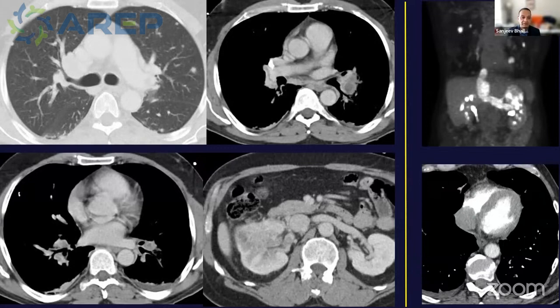Do you see bronchial artery enlargement, which is going to be much more typical of something like chronic PE or Eisenmenger syndrome than it is for acute PE? And of course, looking at the lung parenchyma, do we have mosaic attenuation, more typical of chronic PE? Do we see infarcts? Are the infarcts cavitary? And if we can have this search pattern, this checklist, I think it really helps us make more of a difference in identifying what the filling defects are, and also helping when the embolic disease is not typical of thromboembolic disease, namely tumor emboli, or if it's something along the lines of septic emboli.